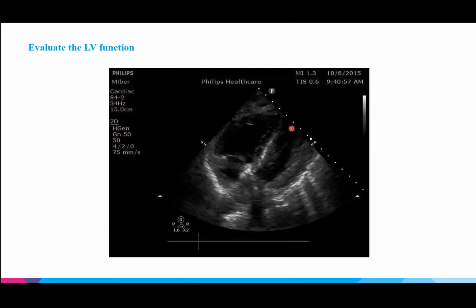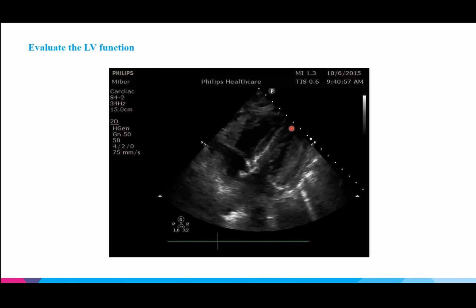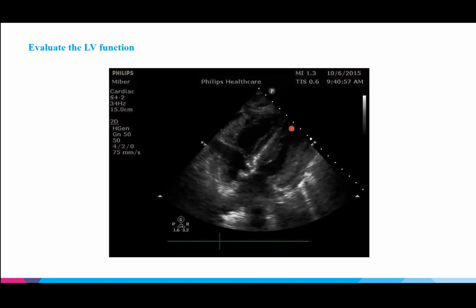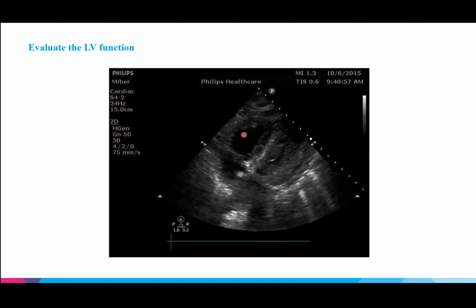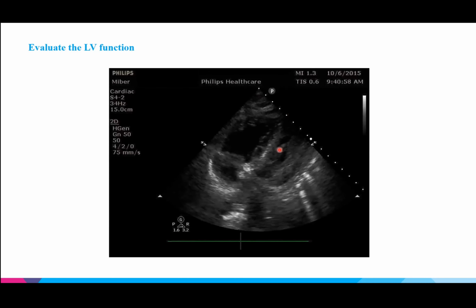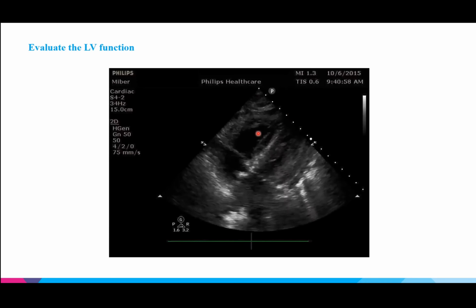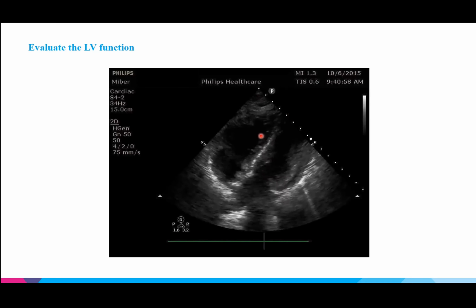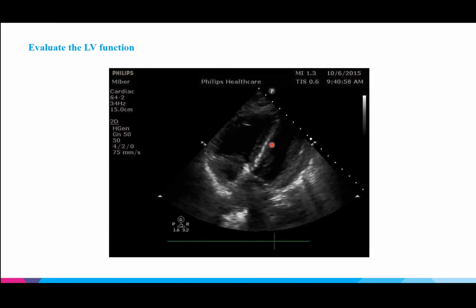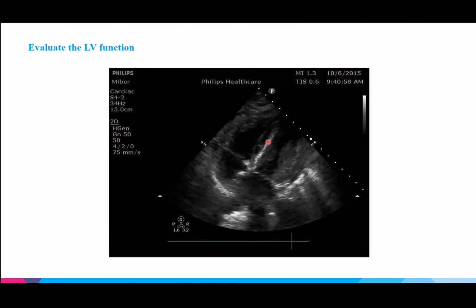What do we think about some of the other structures of the heart? Yeah, so Juan and Arpan are saying RV dilated. Yeah, I definitely would agree, right? If we look, right, our right ventricle, which we'll probably talk about in a future talk, should be 2/3 the size or smaller of the left ventricle. In this clip, the RV actually almost looks bigger to me, right?